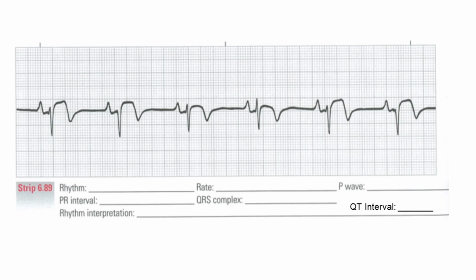The other thing to take note of is that it has some elevated STs. If I draw my isoelectric line, you can see that my STs are elevated, and that is significant. And the T waves are inverted, which also shows signs. So this patient's probably having a STEMI.